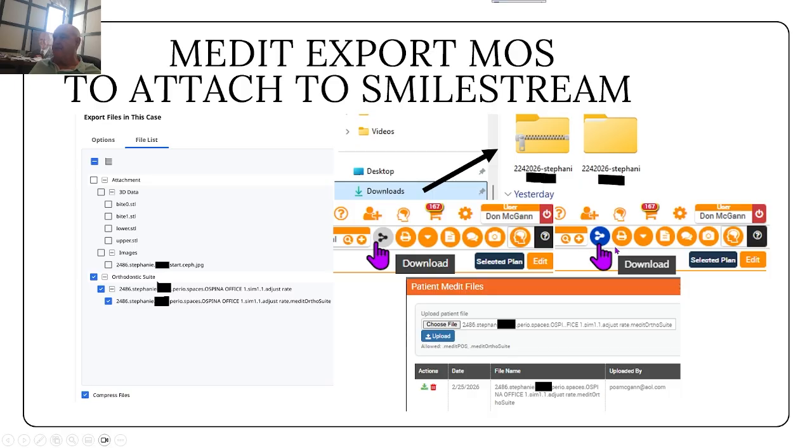It's up there by the names. And then once you have successfully put the MOS file into there by choosing the file, you find it, put it on there, click upload, and now you have a list of which MOS files you have sent or received. You'll get a list, a continuing list.